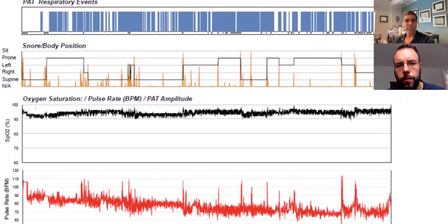The next one is your oxygen saturation. So you want to ideally be above 90%. So once again, it looks like it's a dirty signal. It looks like there's a lot of teeny drops, but they are still contained mostly within the 90%. And you can see it only dropped below 90% just one time. So I think it's real because it occurred in a cluster of oxygen desats. So I do think that low of 88 or 89%, whatever it was, is real.